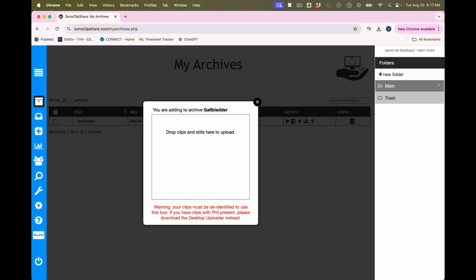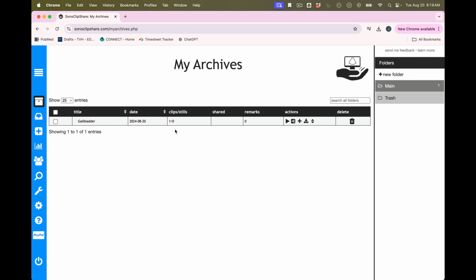So let's say that we want to add another gallbladder clip that we did later onto the gallbladder archive. We're going to load another one on here. And notice that that one is now uploaded. We hit the close button. We're going to hit refresh. And now we have 2 in there.